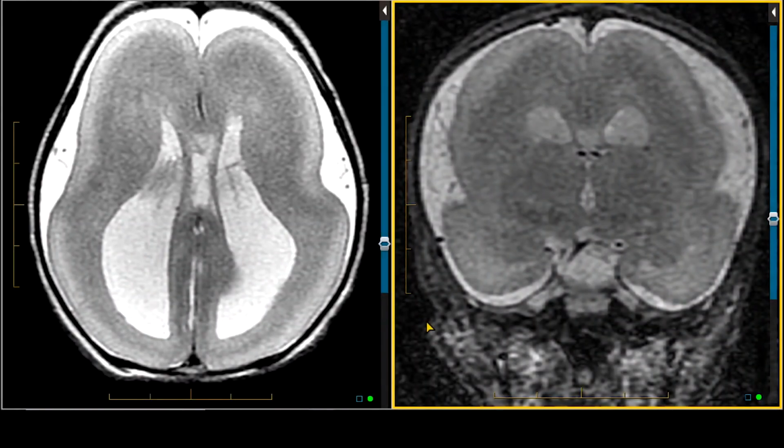This is an MRI of the brain in a 1-week-old child that had an in utero abnormality that wanted to be further characterized. One of the first things we see is this very, very featureless surface sulcation pattern to the brain. We're seeing a rudimentary sylvian fissure on both sides. At most, it looks sort of like a large figure 8, but we're not seeing any other major sulci. Within that, we're seeing enlargement of both lateral ventricles, more pronounced posteriorly.